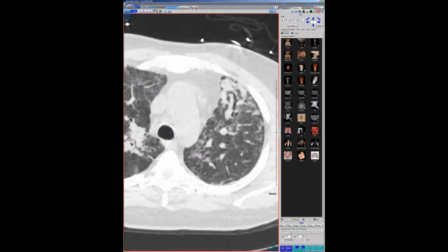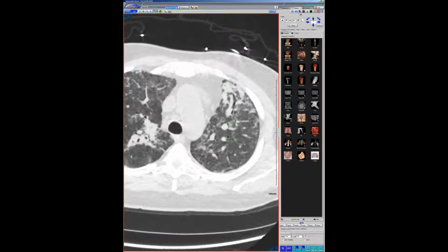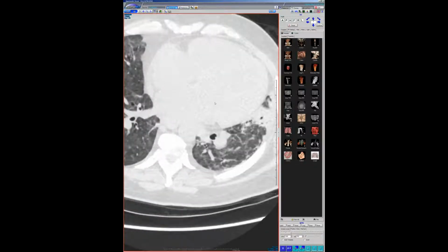Maybe, yeah. And then also, very nicely, a sign that I'm commonly seeing with organizing pneumonia now is this sparing of the peribronchovascular interstitium when it starts to recover. We've seen this in some of our EVALI patients. Anyways, those are my cases. Yeah, that's interesting.